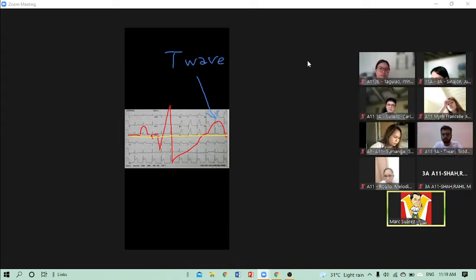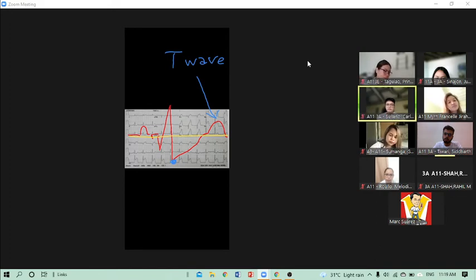So this is the P wave. This is the Q wave. This is the R wave. This is the S wave. Again, this is the isoelectric line. You follow? Yes or no? Yes, Doc. Okay. So what is this one? T wave. I want you to focus now on this one. What are we marking with the blue dot? J point, Doc.